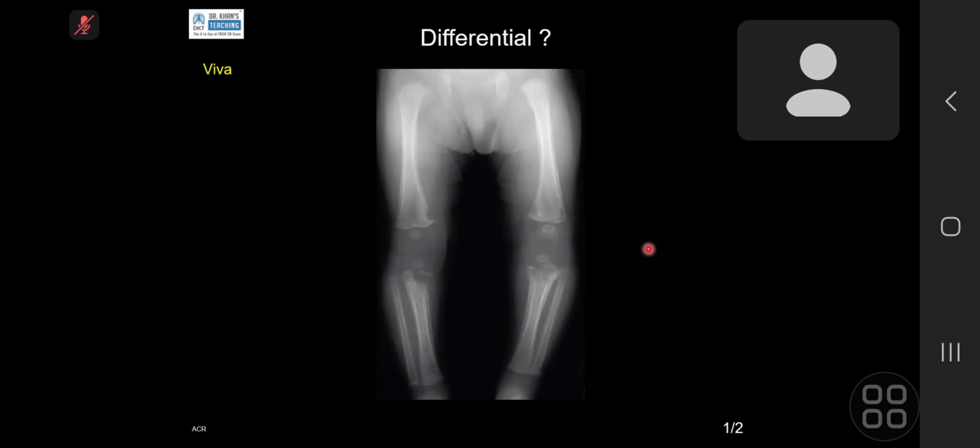Scurvy, because this epiphysis has that Wimberger ring sign. I'll keep my differentials of scurvy as well, and this periosteal reaction might represent subperiosteal hematoma. And this medial pointing of the distal femoral metaphysis could represent Pelkan spur. And there's relative lucency just at the metaphysis, which could represent the Trümmerfeld zone. So yes, these findings are representing features of scurvy.